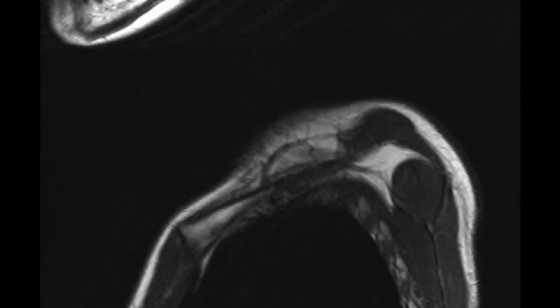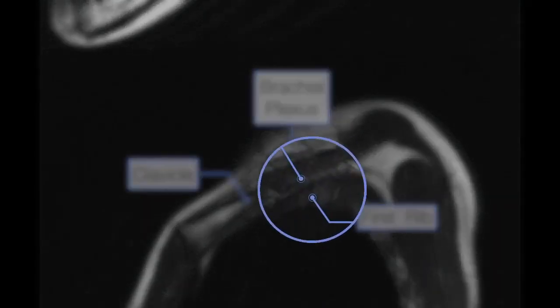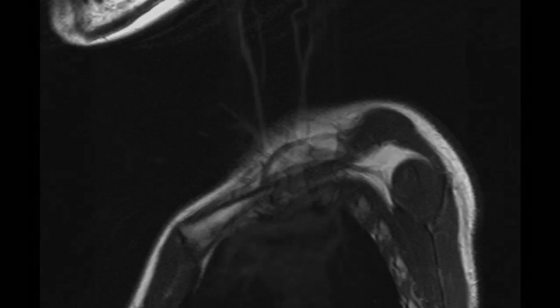With the patient's arms elevated, sagittal images through the right thoracic outlet demonstrate the right clavicle approaching quite close to the right first rib, causing marked narrowing of the space between them, the costoclavicular interval. We can see how the brachial plexus is severely compressed with no residual perineural fat, and it's quite hard to find the lumen of the right subclavian artery due to compression.